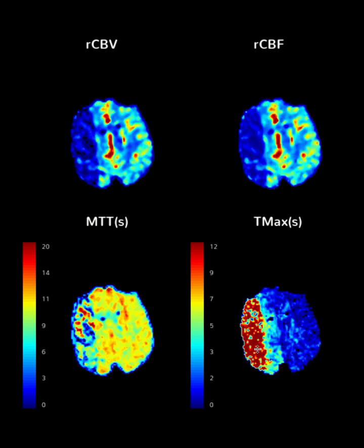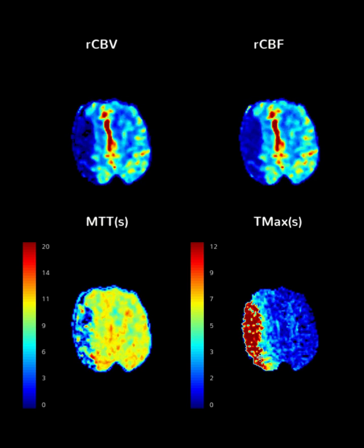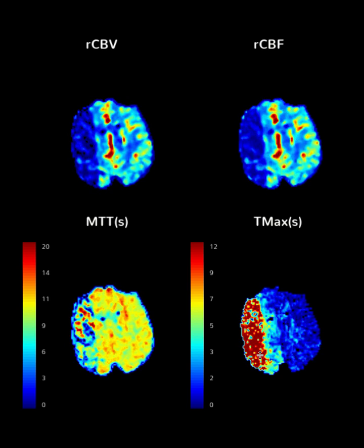So this is a critical delay in right cerebral perfusion that shows with red. That's the scale: it shows a normal perfusion, and as it goes higher, you're going to have decreased perfusion. The more red we have, the more critical it is, and yellow is still low perfused, but the red basically shows that this is a critical low perfusion. So now we know the right side of the brain is just not perfused very well. So now we know there's something going on.